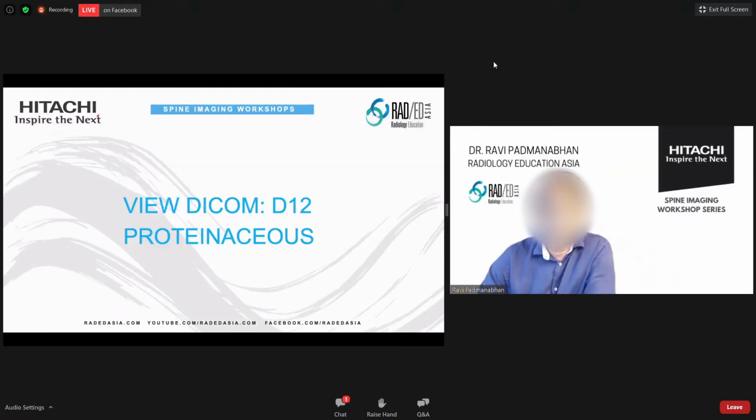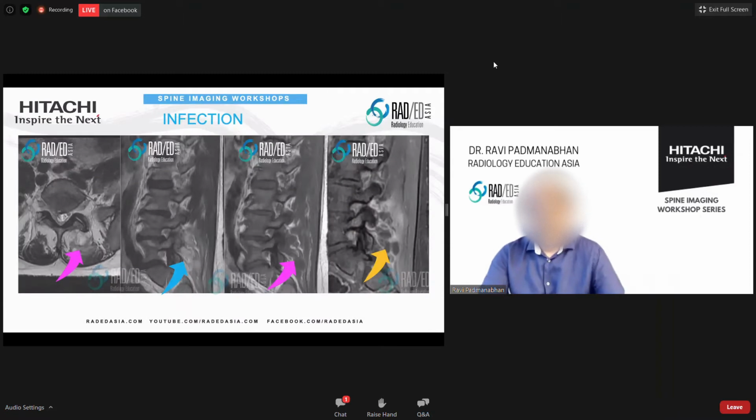So we won't look through the DICOM on that. We're just going to talk about one last thing, which is infection. Now, facet cysts can get infected, but generally it's not the cyst itself. What happens is that you end up with a facet joint infection, and then you can get infected cysts developing around the facet joint. And again, if we look at these images, this is a T2 weighted scan. Here's the cyst, but it is very hard to see it because we've got fat on either side.